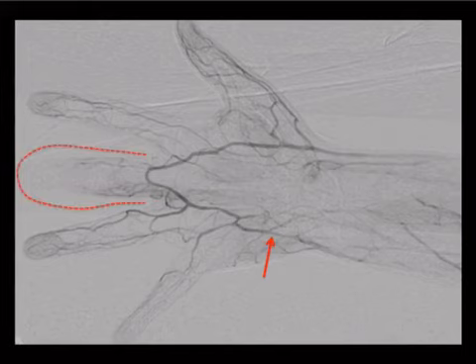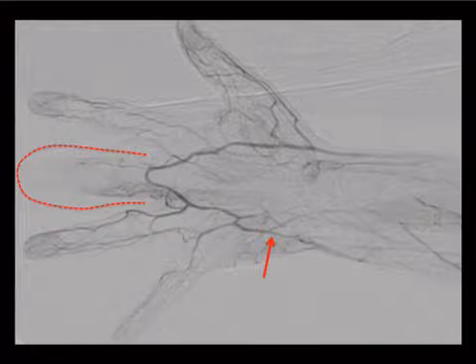So this is what I'm talking about as far as embolic stuff. We don't see any corkscrew vessels, but we've got this, and we've got our ulnar artery that looks normal, but we're missing vasculature out to the tip of the finger here. So compare this and this to that. This is out, right? This was a guy who had a known hypercoagulable state, but it could be from whatever.